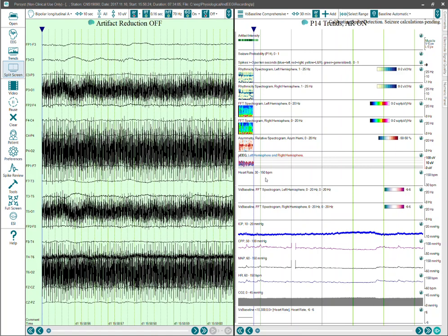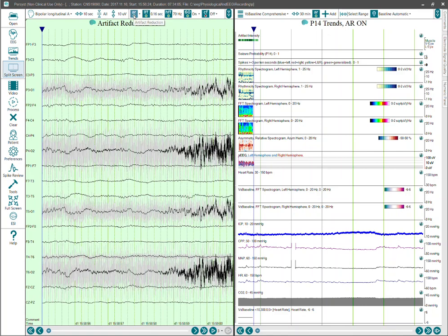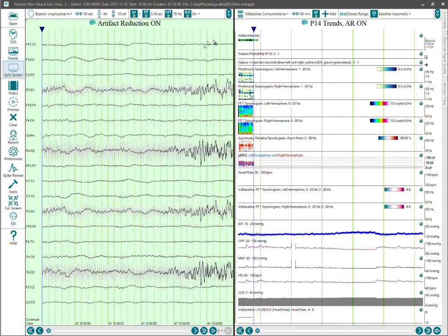But aside from all that, the main thing to note is that right away, these trends get plotted. So even though it's calculating artifact reduction and so forth, we've got a significant amount of artifact in some channels here. I created a custom 75 hertz band stop, which attenuates it a bit more. But the artifact reduction really helps separate some of that quantization error, at least in this particular recording, to be able to see the underlying signal. Aside from that, these are displayed right away because they're already calculated. They're already part of the recording file.